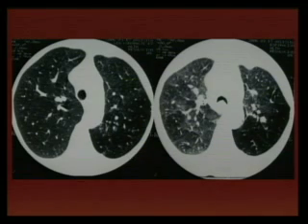Here we have a case with a high-resolution CT during inspiration and during expiration. You can recognize that this is an expiratory film because there is a bowing, anterior displacement, of the posterior trachea. The posterior membrane, normally in the inspiratory phase, is convex. Here it is bowing anteriorly.